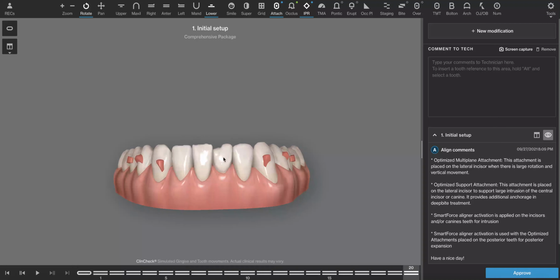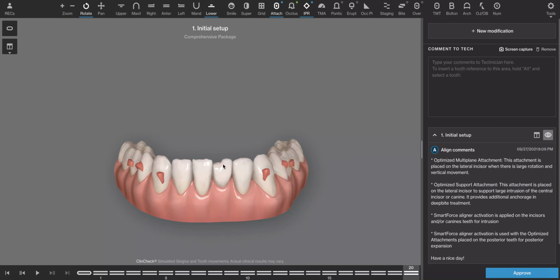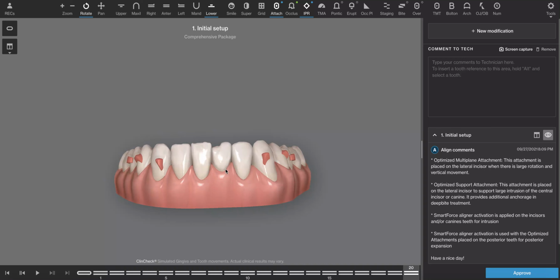Obviously this tooth here, we don't like where it is gingivally. I would maybe ask the technician to intrude that tooth, telling the patient that when you're done, this tooth will be restored back to its ideal location. This tooth has obviously worn considerably. It's gone through compensatory eruption in an extrusive manner, giving the CEJ a much more superior position in relation to the adjacent teeth. Small thing, but if you're going to fix this guy up, it's something you might want to consider.